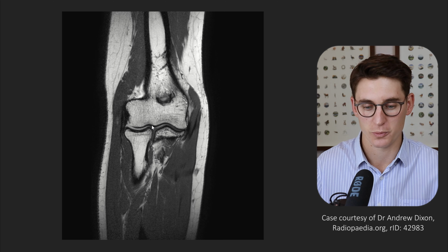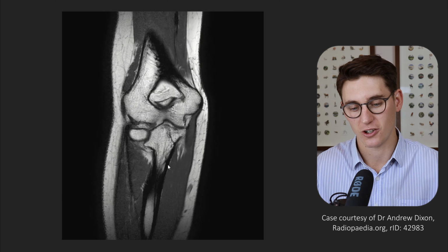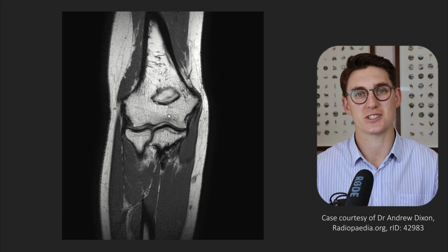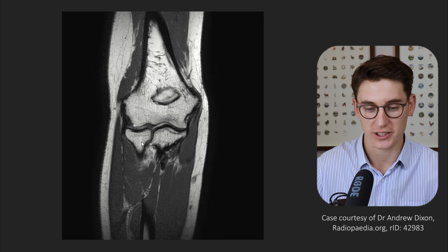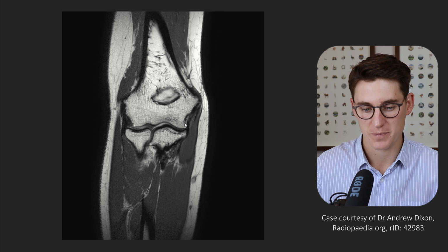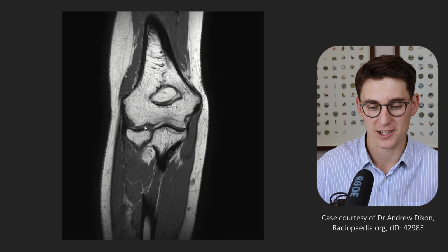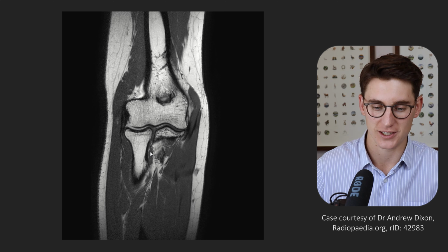Our humerus superiorly, and distally we have our radius on the lateral side and our ulna on our medial side here. The distal humerus can be separated into multiple different sections depending on the ossification centers that created that distal humerus. We've got our lateral epicondyle laterally on the side of the radius, our medial epicondyle on the medial side of the elbow joint. Then we have our trochlea, which articulates with the trochlear notch of the ulnar bone. And then we have our capitellum, our small head here, that articulates with the radial head at our radiocapitellar joint.